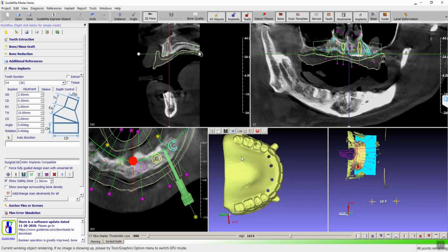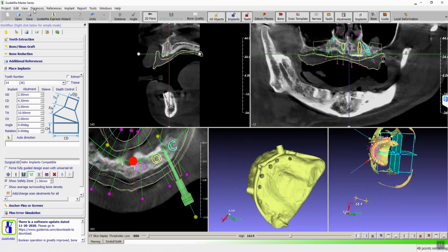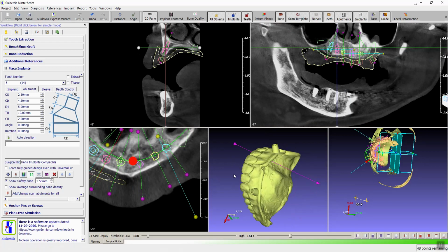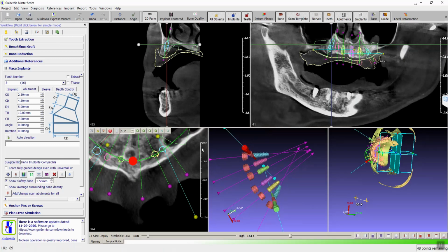It's going to be the old ones, I bet. I don't even have that in storage. I'll get you the new scan abutments. Okay, let me check this. I don't even have the STL file, but otherwise I should display that, right?